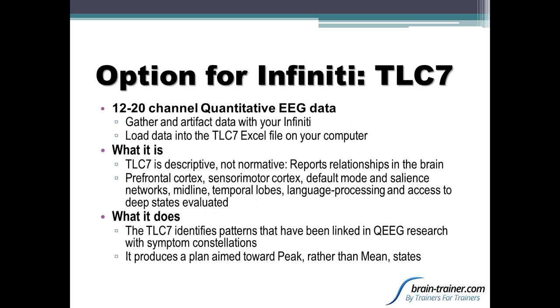The TLC looks at the prefrontal. It looks at the sensory motor cortex, the C3, CZ, C4. It looks at the default mode network and the salience network. It looks at the midline. It looks at the temporal lobes. It looks at language processing, Broca's and Wernicke's areas, and the ability of the brain to access deeper states, to be in contact with its own subconscious, among other things. So it's a pretty broad look at the brain, and it's looking at the same areas that the QEEG would be.